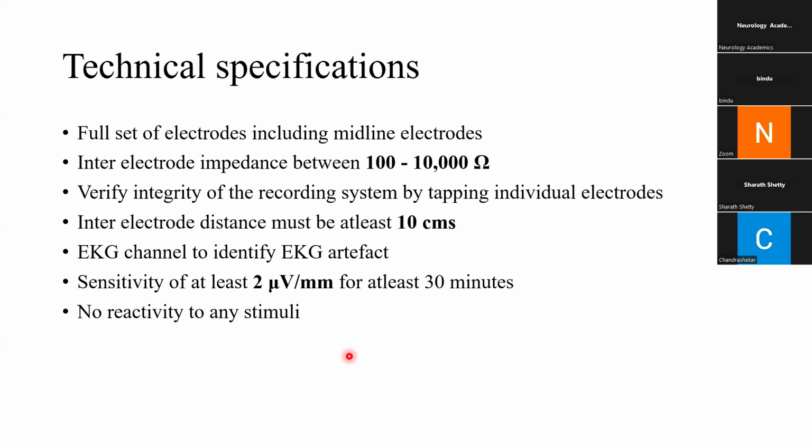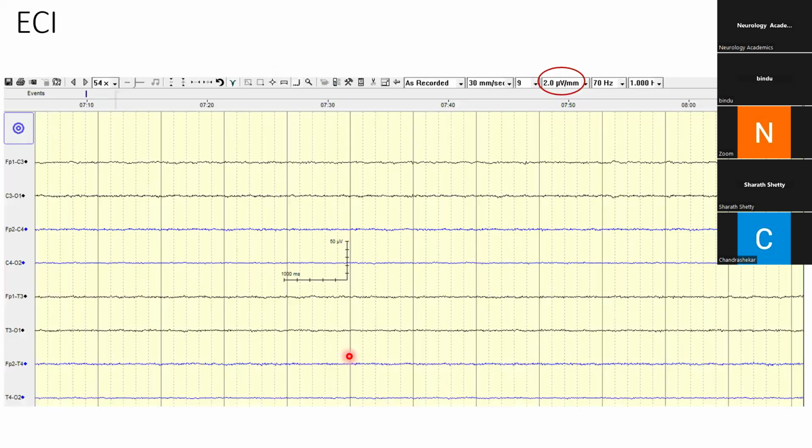Here we can see a generalized suppression, and no cerebral activity even with the sensitivity set at 2 microvolt per mm.